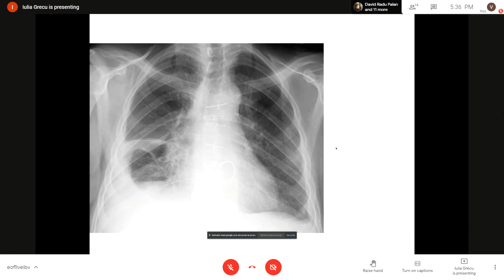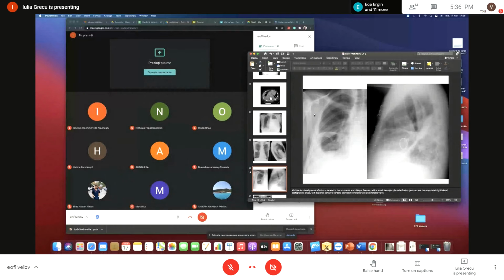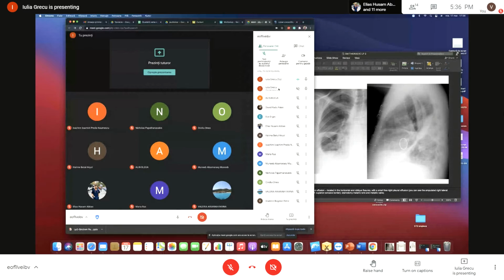what can you tell me about this frontal film? I will just name one of you so that I can get answers maybe from all of you. So Aline, I will start with Aline. Yes, I'm here.